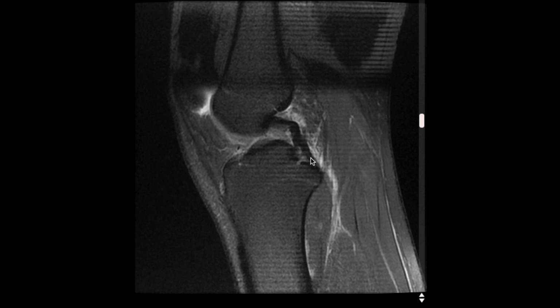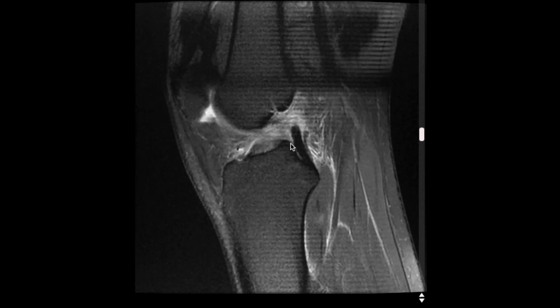As we continue to scroll, what you'll see coming across the back is your posterior cruciate ligament. That posterior cruciate ligament is usually a little bit easier to see than your ACL. And what you should see is a nice, smooth black line coming down the back to show you a very stable and intact PCL. Now, what we'll be looking for next is an ACL that comes up through the front of the knee towards the back.